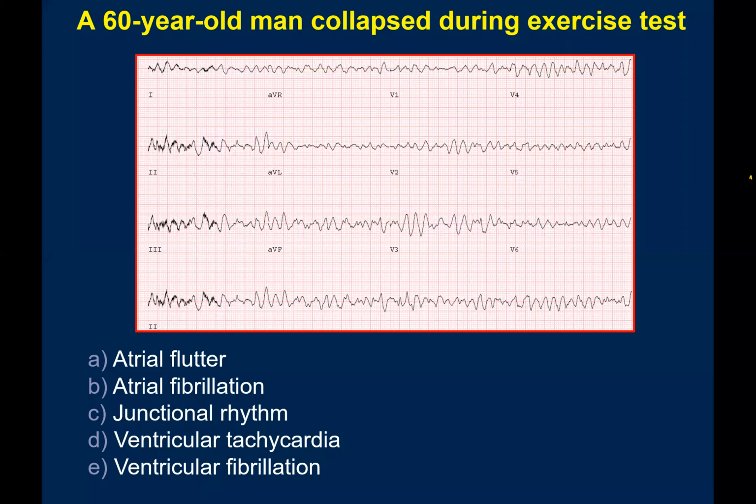Especially, you'll see it in the post-operative patient in ICU. The leads may not be fixed well, and then you see artifacts like this, the patient is hemodynamically stable. This could not be VF or polymorphic VT. It's just artifacts. By the way, generally artifacts will happen in 1 or 2 leads, not all the leads. Here you see on all the leads, there is a problem. So this is a VF.